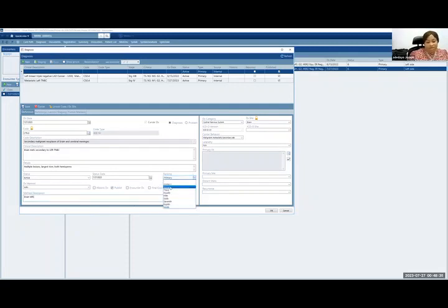Now the primary here, ranking is going to be second. This is the second malignancy, so to speak, that she's being diagnosed with. I'm coming to this other side. All this information is there. So the ICD version, the disease site, the malignant, the laterality is not available because it is the brain. It's not applicable because it is the brain.